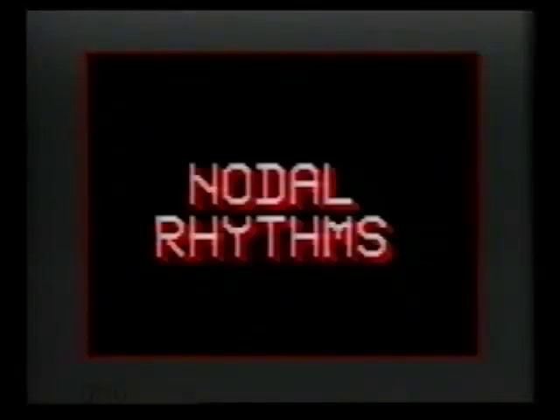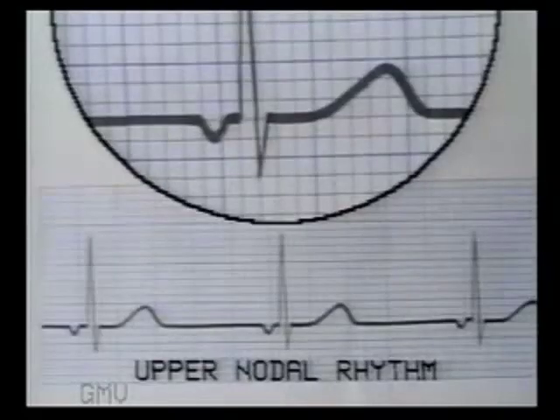Nodal rhythm, also termed junctional rhythm. When the impulses originate in the AV node, the rhythm is termed nodal rhythm. The heart rate with nodal rhythm is very slow, about 40 to 60 per minute. This ECG shows a heart rate of 1500 divided by 26, that is 58 per minute.